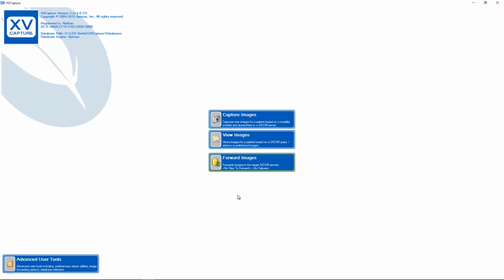We have now completed the steps for finding missing patient data information and making the corrections to that patient to update to the system.